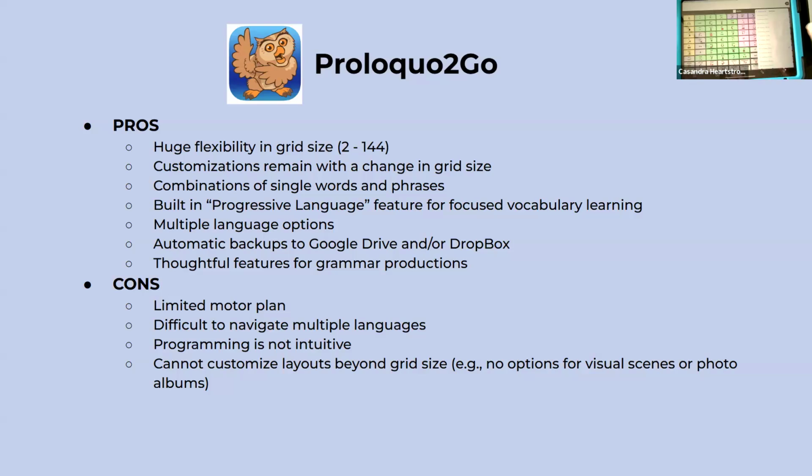It's got combinations of single words and phrases. I say, and then also in the chat function, you're welcome. What do you think? Do you understand? So you've got those options in there as well.